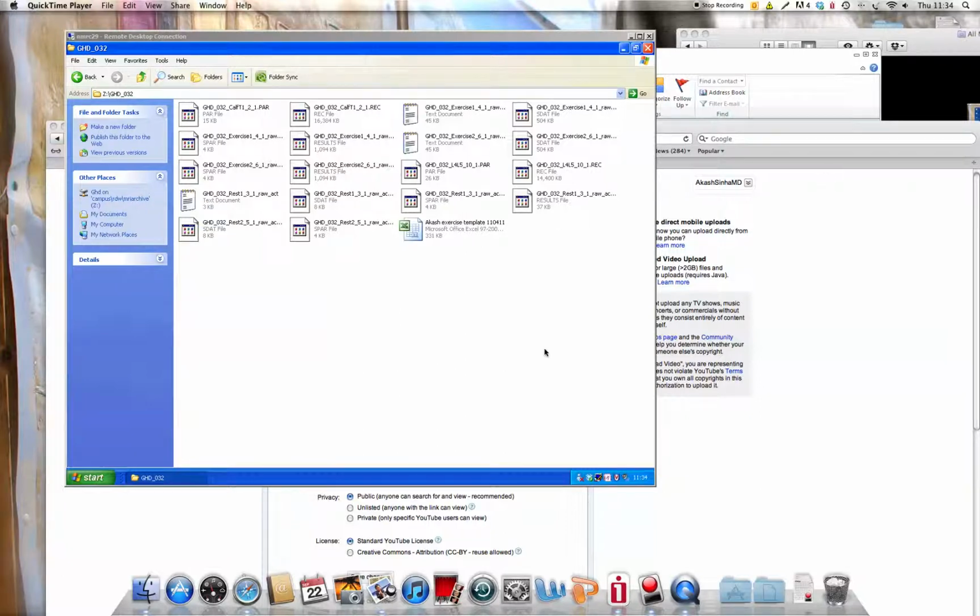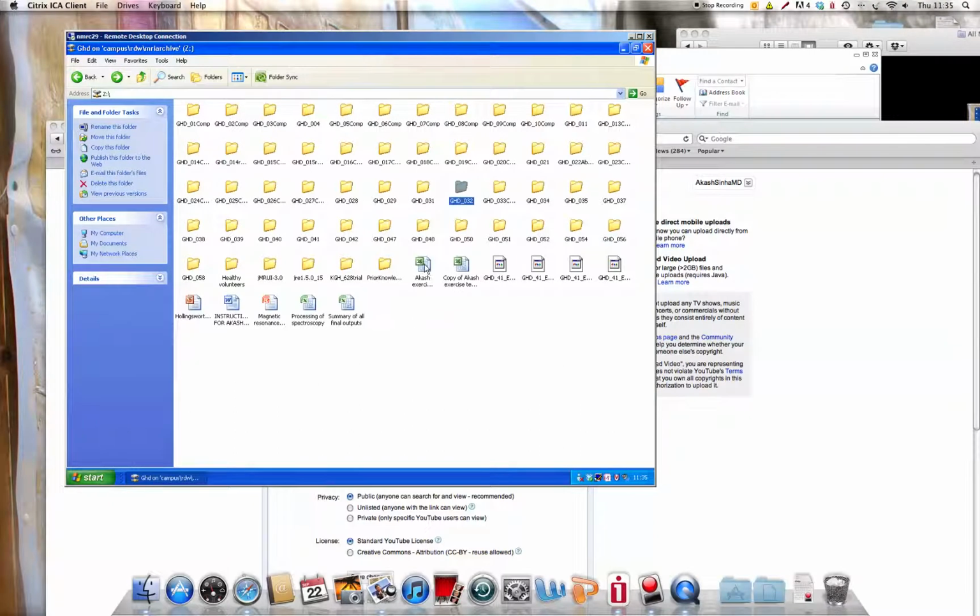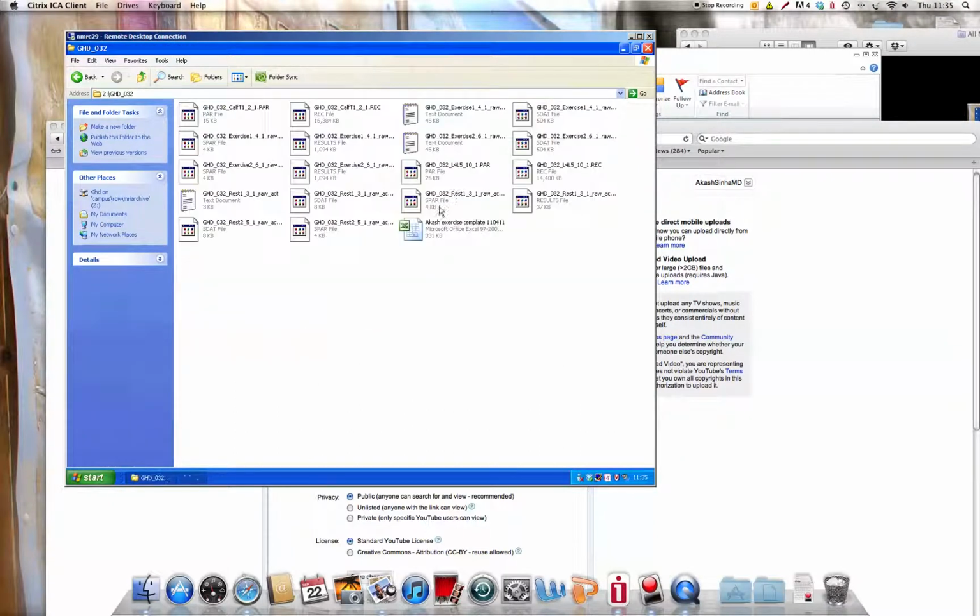So now that we've done the GMRI processing, the next step is the fitting of the data into a curve. For that we use a template which has again been devised by the very clever Dr. Kieran Hollingsworth. So what I do is we've got a template here, copy that into the specific folder of that patient or volunteer. That's the folder there.